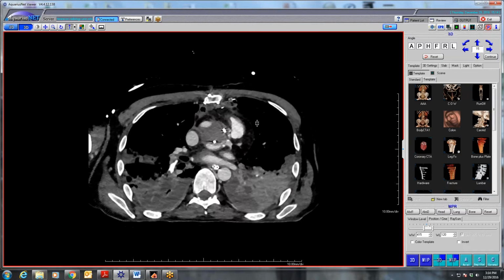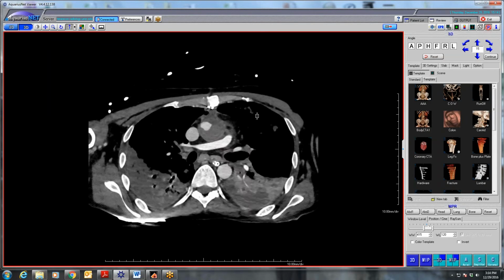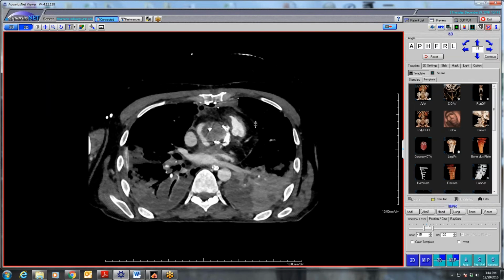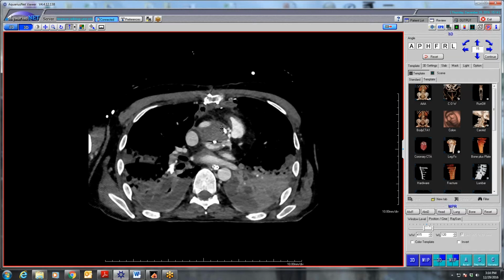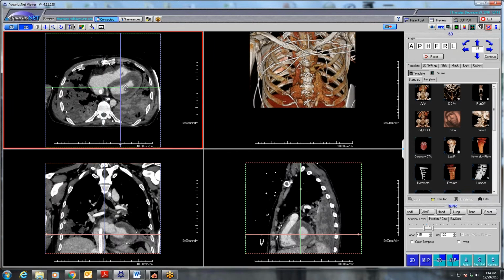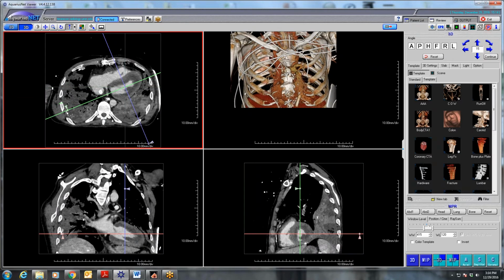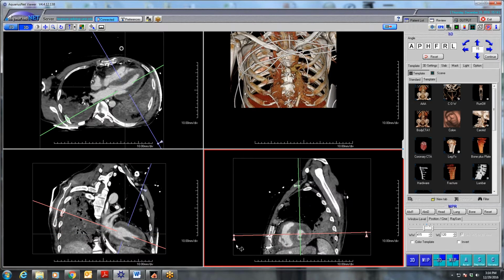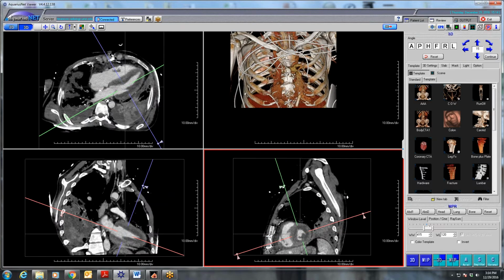The aorta is pretty much occluded except for this elephant trunk graft, or elephant nose graft, that's trying to feed the coronaries coming from here. And now we can see on this little bit of delay, you always say if you see diffuse subendocardial enhancement, it's never usually coronary disease because you wouldn't be alive.